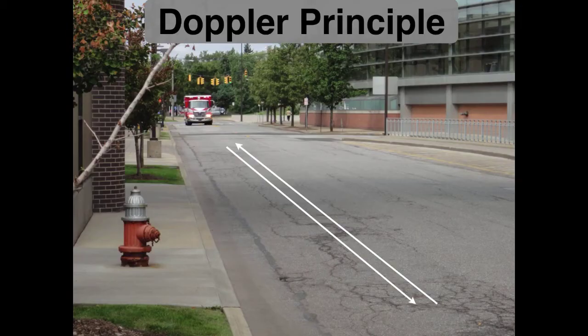All right, let's look at the Doppler principle. Whenever there's relative motion between a sound source and a listener, the sound frequency heard by the listener differs from that produced by the sound source. This change in the perceived frequency relative to the transmitted frequency is called the Doppler shift.